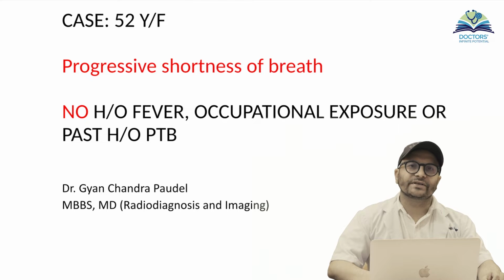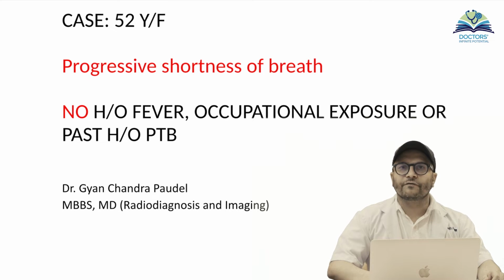Today I am going to present a case of a 52-year-old female who presented with progressive shortness of breath with no history of fever, occupational exposure, no chronic drug intake or past history of pulmonary tuberculosis, for which HRCT chest was suggested.